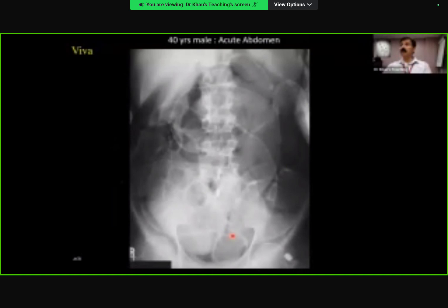This is your last case, and then number 6 should be ready. If you can tackle it as a viva film, and I'm listening to your description, please. Over to you.